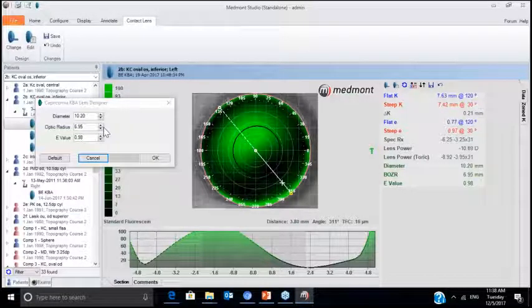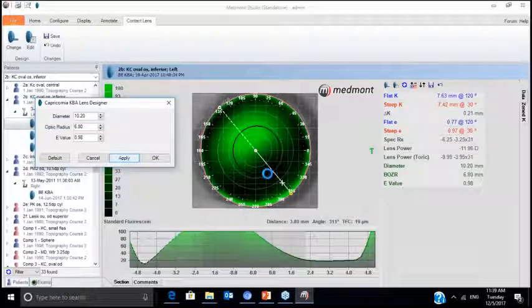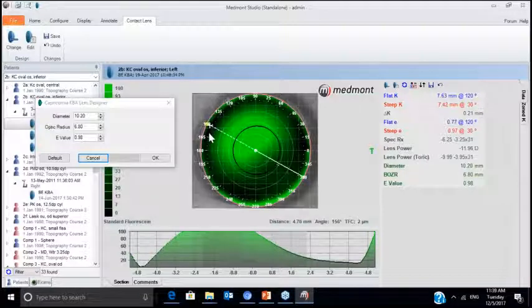If we click our cursor in this deeper pooling here, we're up to 102 microns, and a bubble can form at around 90 microns. So we have too much fluid under the apex, where at the visual axis, we have so much fluid within the pupil, we may just get a bubble underneath our contact lens.